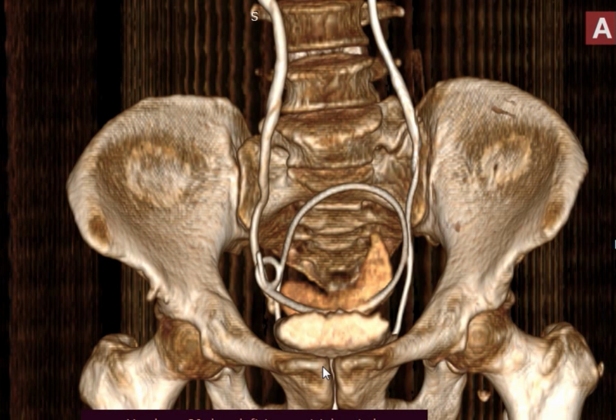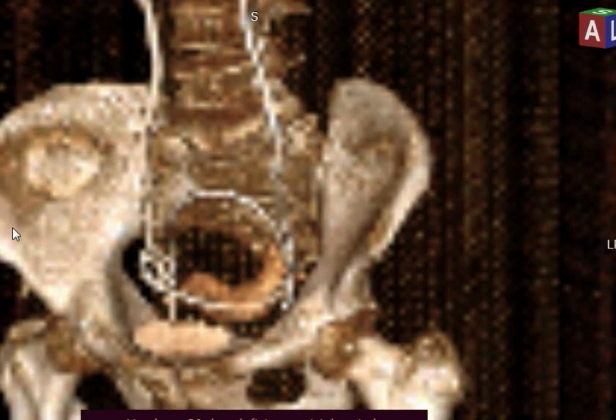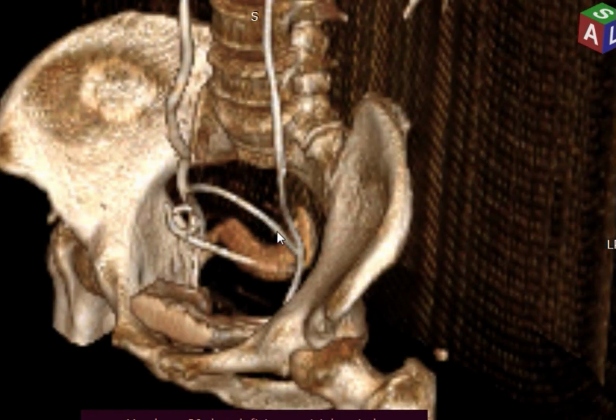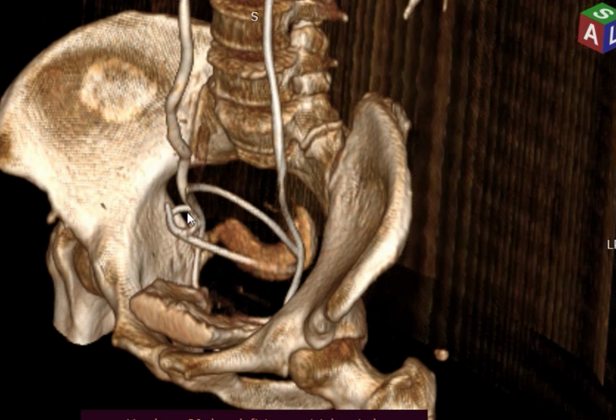Then he comes on the right side, puts it, it went out of the ureter and coiled in the recto-vaginal pouch, this thing here. So the urine is coming like that and coming back like that, collecting in here. Let's do a lateral view where it's collected here. This is the bladder. See? It's like that, making a loop.